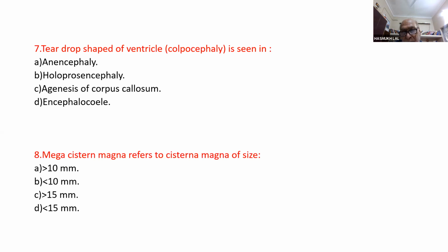Anything, sir? Ashok, sir? Yes, absolutely. So you see, the sensitivity of a sign like a teardrop shape tells us that when we look at ventricles, we should look not only at the size, but at the shape. And we know that we then get to see agenesis of the corpus callosum. The importance here is that we don't want to miss this sign.